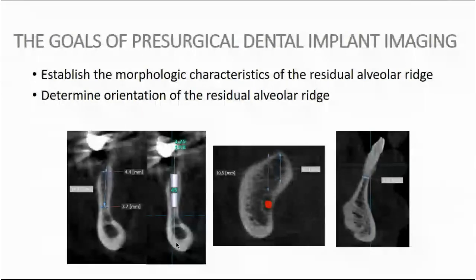So in the middle picture, we will see the significant undermining of the lingual part of the ridge, and we will understand that when we are performing the procedure in this part, we will have to change the inclination of the implant, which could lead us to some prosthetic problems, or we will need to use shorter implants to avoid damage to the lingual cortex, or the lingual cortex will stop us from making the planned length for the implant.